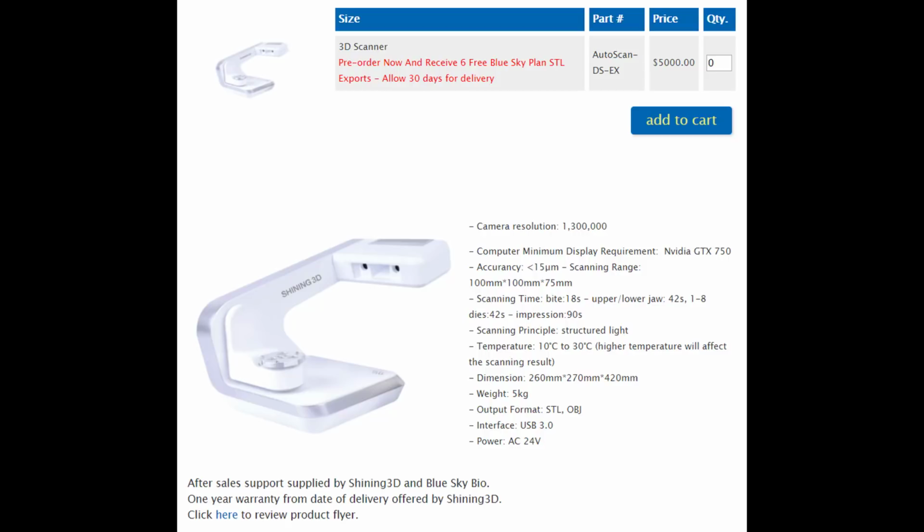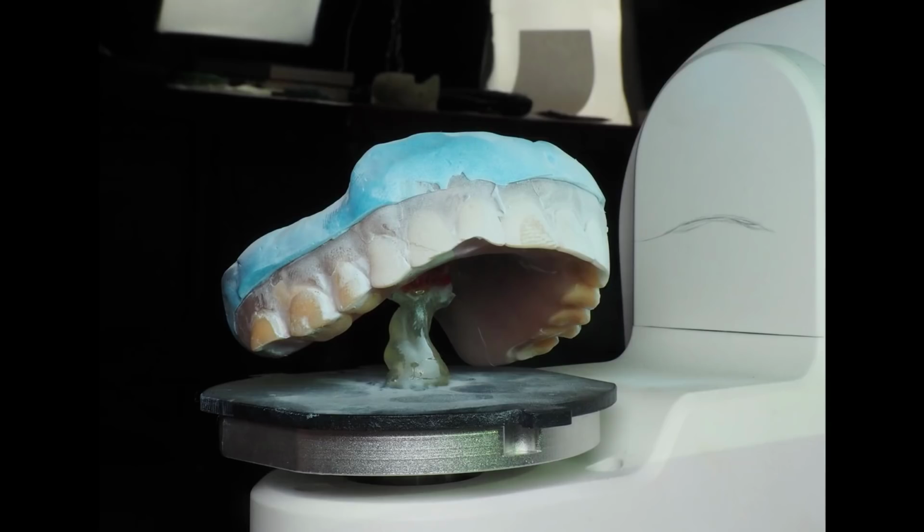This works really well. You can orient impressions and bite rims and all of those things onto the scanning plate and digitize those. This is the way I do that. I create a little pedestal of triad gel material, and I just orient that into the base, because really what I'm wanting to capture mainly is the entire interior of this impression so that I get accurate soft tissue contours, and then I just need this exterior surface enough to see the teeth so that I can orient myself to where was his existing incisal edge, and be able to use that to articulate the buccal bite that you'll also take of these.